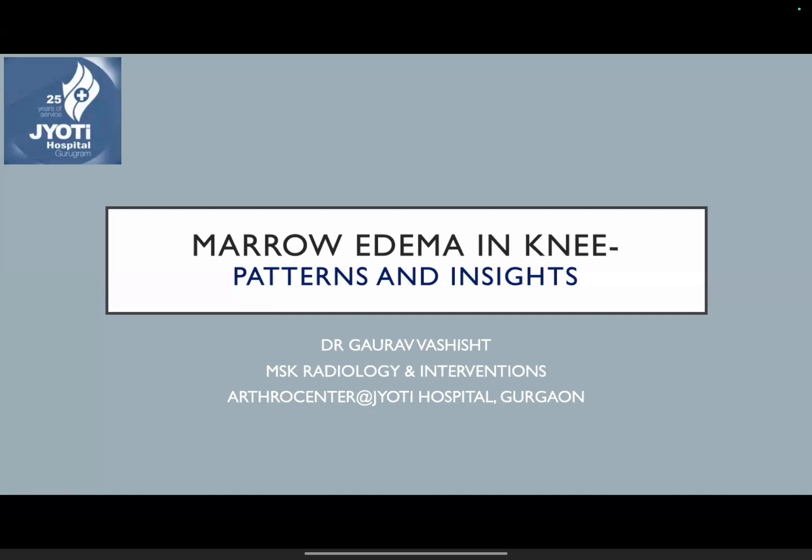Good evening, everyone. Thank you all for joining this session. My topic for today is marrow edema patterns in the knee, which is one of the most common scenarios we encounter in daily practice. We will be discussing various patterns and learn some insights out of them.